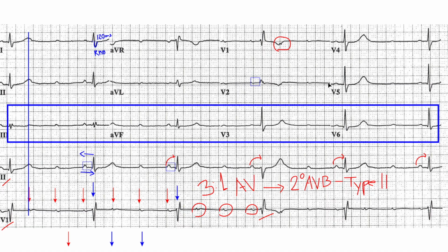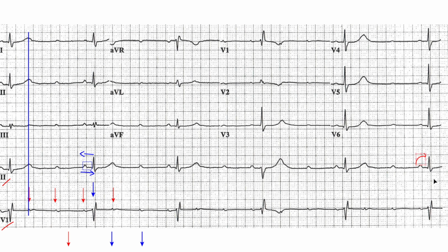But I do want to talk about, sorry, I'm just going to delete a bunch of this stuff. I do want to talk about this right here, because this is unexplained, okay? And I don't like things unexplained on the ECG. And this gets us into a far more advanced session on an ECG.